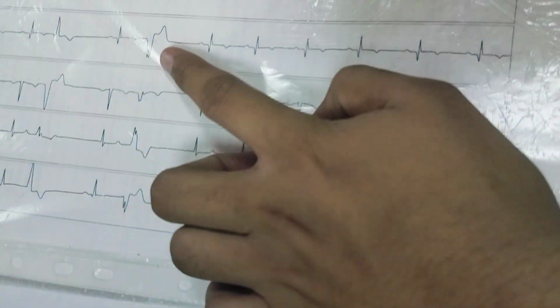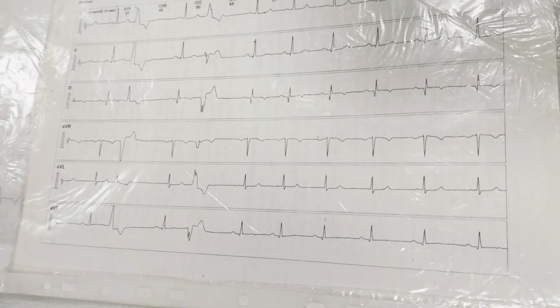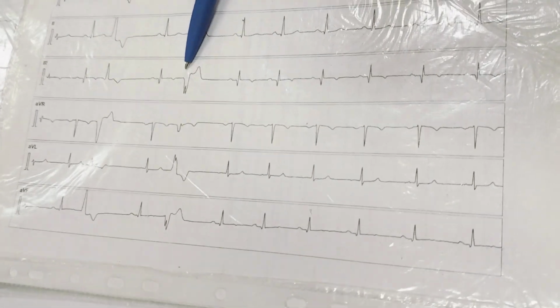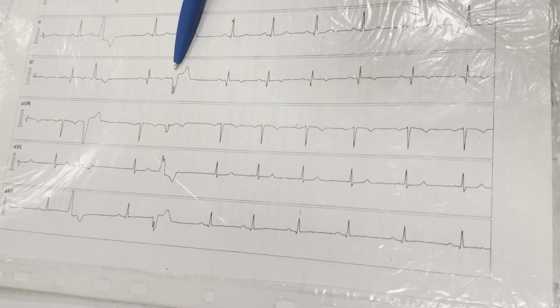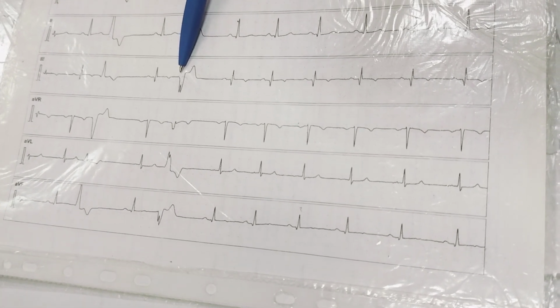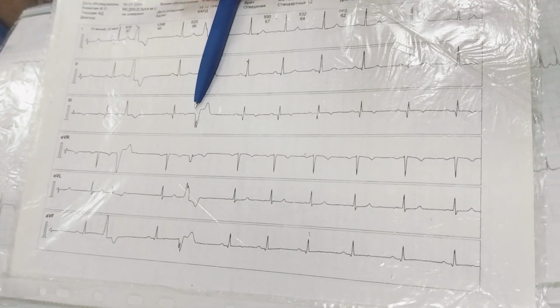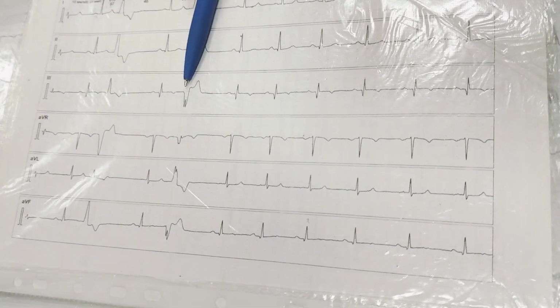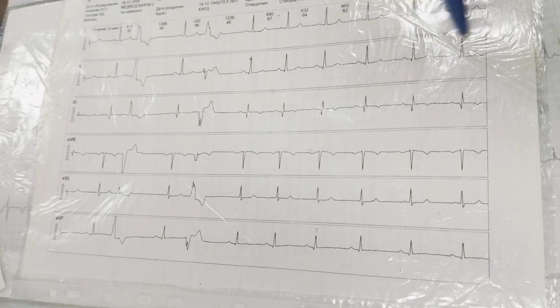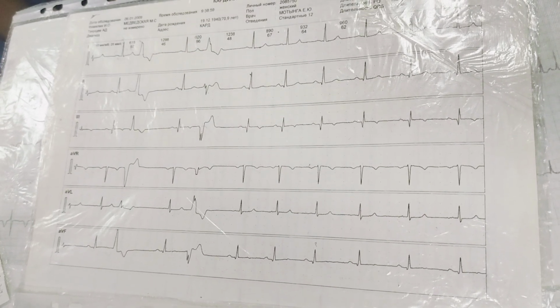Doctor, in this case is it normal? It's abnormal, it's an extrasystolic complex. Sometimes students think of these complexes like myocardial infarction. Can myocardial infarction appear for one complex and disappear? Myocardial infarction is present for months, in every complex. It will not disappear. If it happened and disappeared, it is extrasystole.